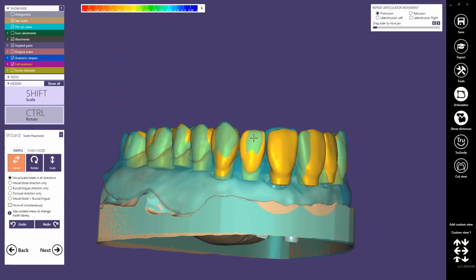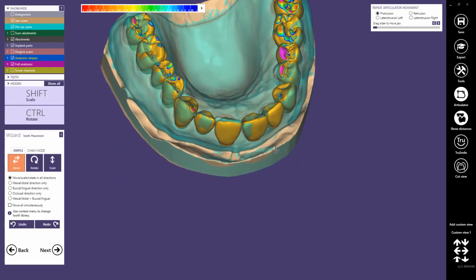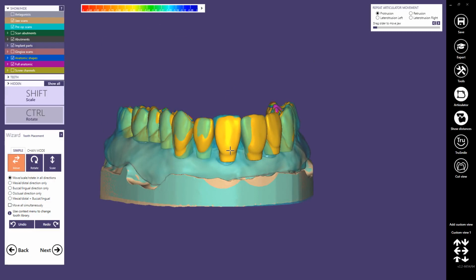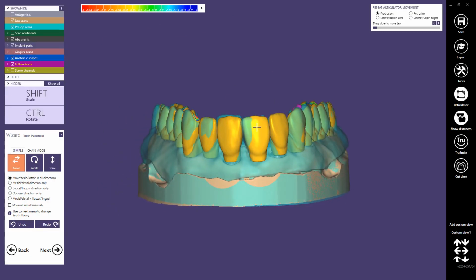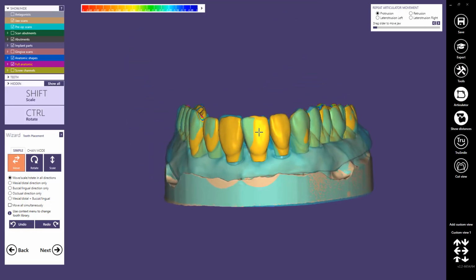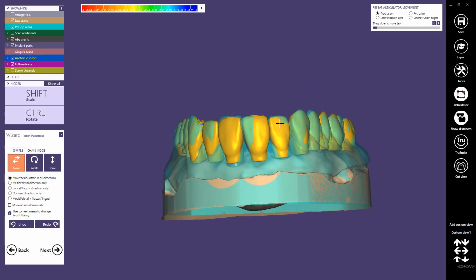As for the thimble crowns, this is important, because I recommend not to use the freeform before you use the cutbacks thimbles.